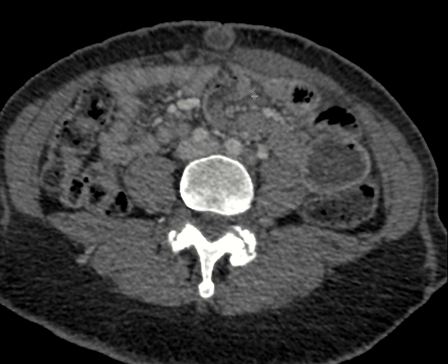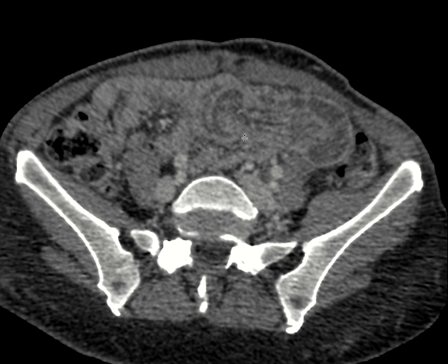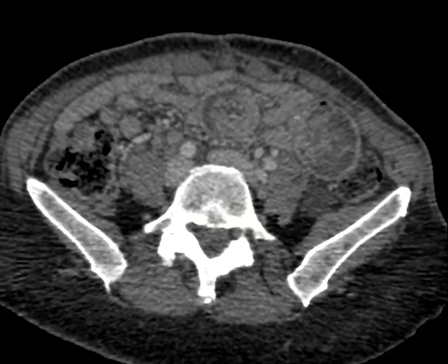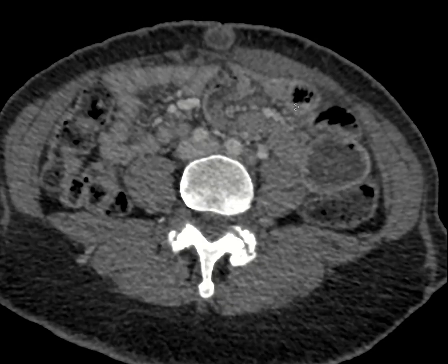But what's actually causing this mass, we can actually see the mesenteric fat right here and the mesenteric vessels being pulled retrograde into the jejunum along with a loop of jejunum. And so this ends up being a jejuno-jejunal intussusception. And since this is occurring in a retrograde fashion, this is called a retrograde intussusception.